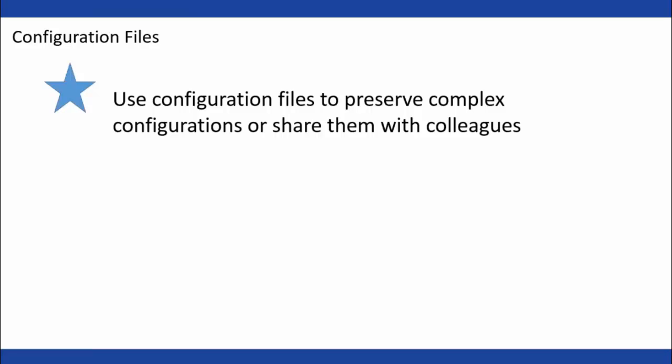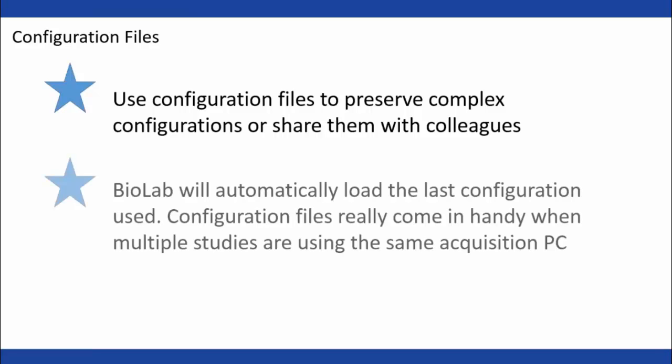So use configuration files to preserve complex configurations or share them with anyone else who would want to use that same configuration. And remember that BioLab will automatically load the last configuration used. So if you're the only person using your acquisition system, then you don't need to worry about configuration files as much. But if you have multiple studies occurring using the same acquisition PC, then it's really helpful to have these configuration files so you can quickly, with the press of a couple buttons, switch between various configurations for various styles of acquisition.